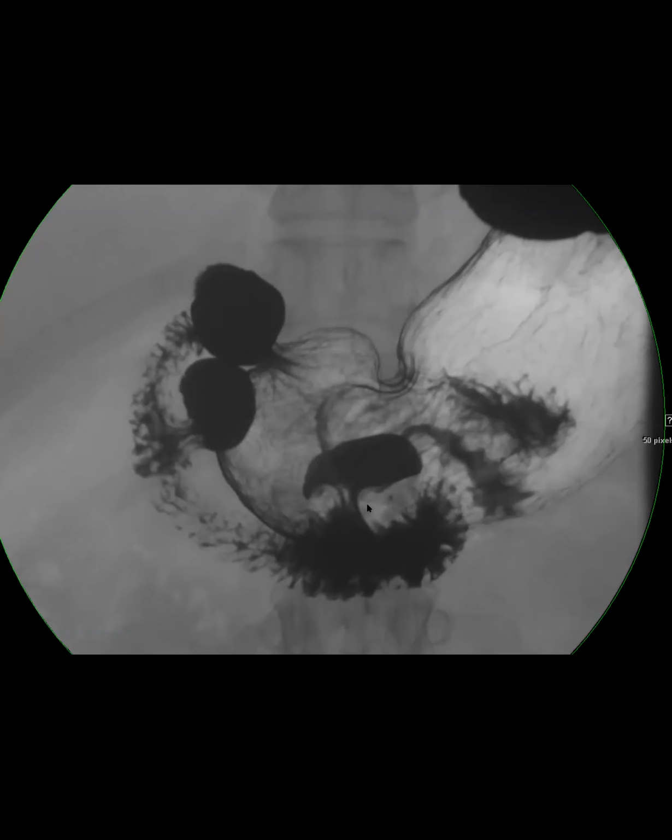Yes, Bram says duodenal diverticula. Good. So this was just a cute example of duodenal tics. These are very common. Of all the small bowel, the duodenum has the most tics, and about 22% of patients have duodenal tics. The most common area is this periampullary area.